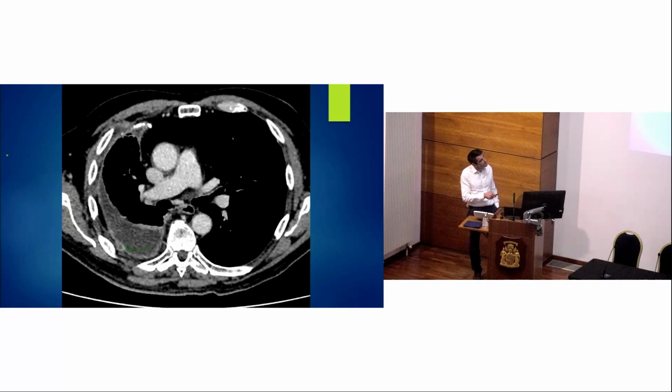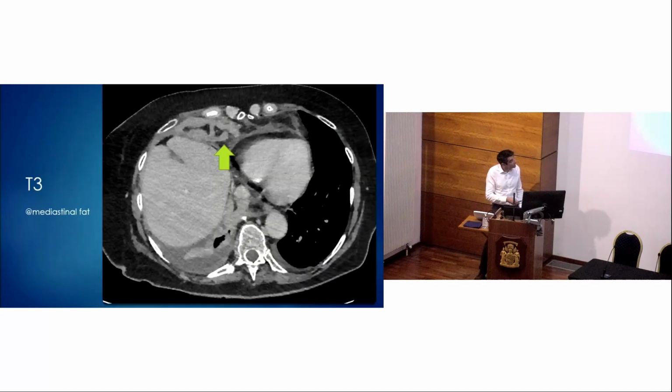And that's going to be invasion. And we know that, because it's gone beyond the intercostal stripe, it must be into and through the endothoracic fascia, which is a descriptor, in fact, for T3 disease. So the other descriptors for T3 disease are this one, for example, where we've got now quite nodular, thick tumour up here, and that's invading into this anterior mediastinal pericardiac fat, consistent with T3 disease.